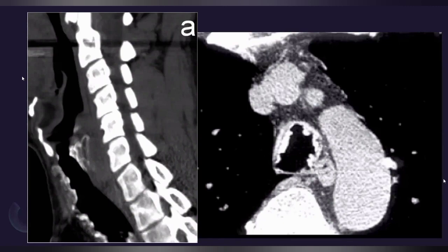So can you now give the diagnosis? Yes, sir. I'm unable to recall, but there is a cartilaginous tracheobronchopathia osteochondroplastica, right? Yes, TPO, so you can say TPO. Okay. So this is what it is basically: a cartilaginous lesion with calcification, sparing the posterior wall.